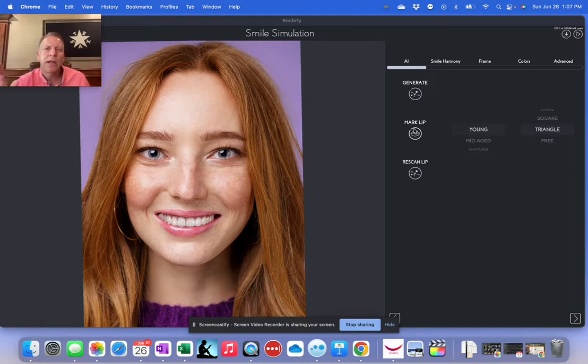But I always wonder how well the smile simulation and what you can deliver clinically are going to match up if you just rely upon the AI doing all the figuring for you. But yet it is helpful to give you an idea where this could be going.